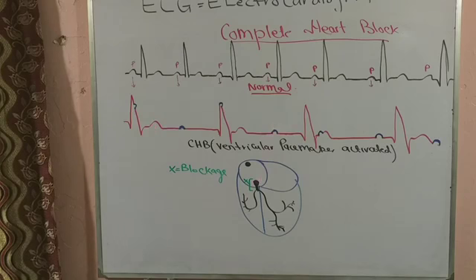So the first thing you will notice in these patients is that you will not find an association of the P with the QRS complexes, but you will then have to look for the P wave, because the P will be coming at a normal rate of 60 to 90 times per minute, but it may land anywhere on the ECG tracing. So you will have to look for it. It may be embedded or buried somewhere in the QRS complex. It may be on the isoelectric line. It may be on top of the T wave. It may be before the T wave or after the T wave.